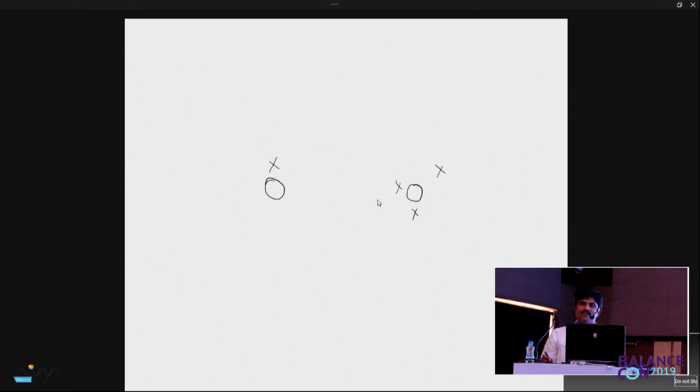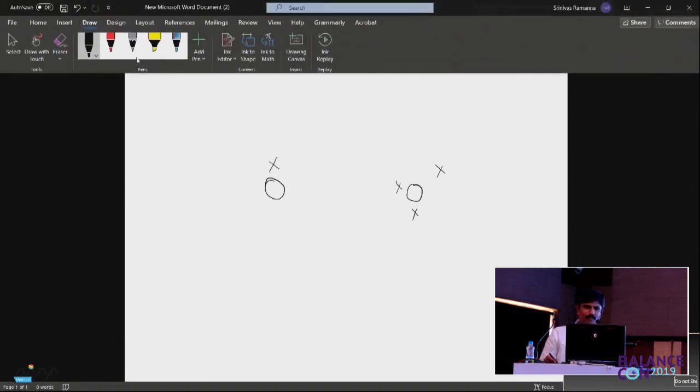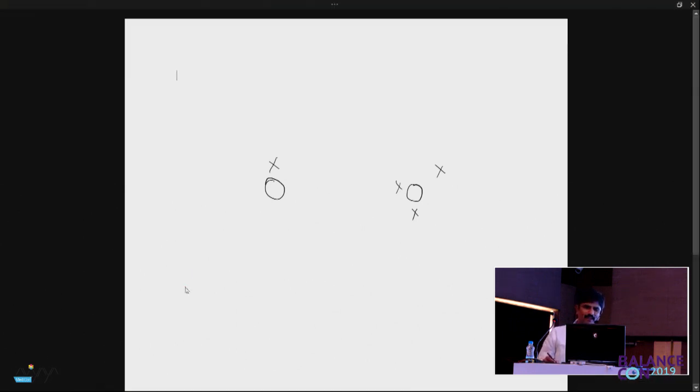So in the previous example of hypometria, there is an underestimation, it falls short, again it falls short, and then it reaches the final point. Whereas in a hypermetria, it goes beyond the target. If this was the target where it is supposed to end, it goes beyond it, stays there for some time, realizes that the eye has gone beyond, and goes back. When coming back also, again it does the overestimation.